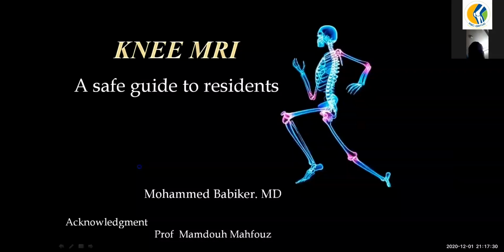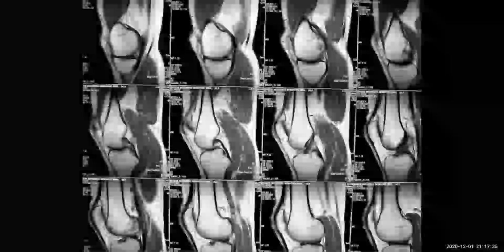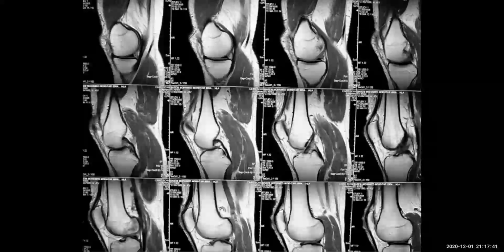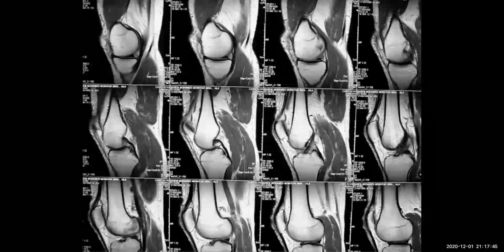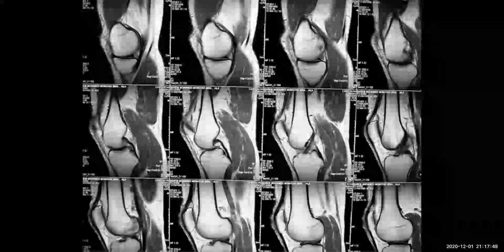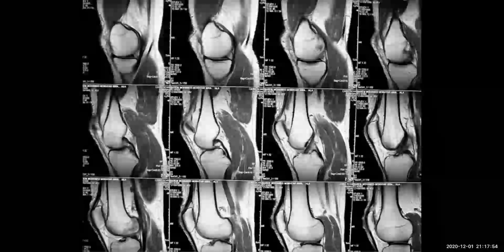First of all, I want you to have a look at this MRI. Just try to have a deep insight into this MRI, and think about how you can read it using your own approach.